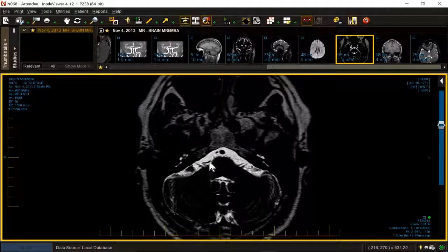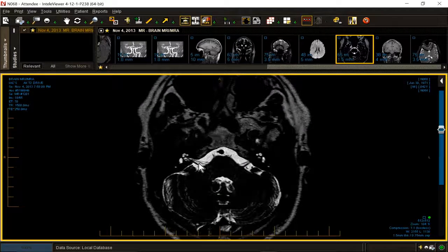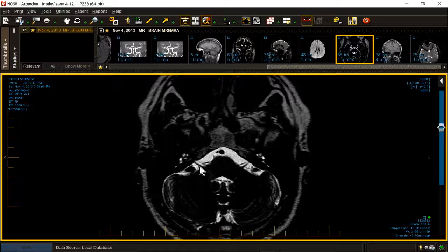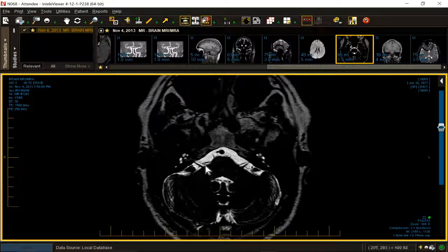We've got an asymmetric loop contributing to the morphology at the base of the 7th and 8th nerve complex. Now, the 7th one is the first one you encounter. 7 up, coke down. The 7th nerve is in contact with this vessel. And this patient has ear pain.